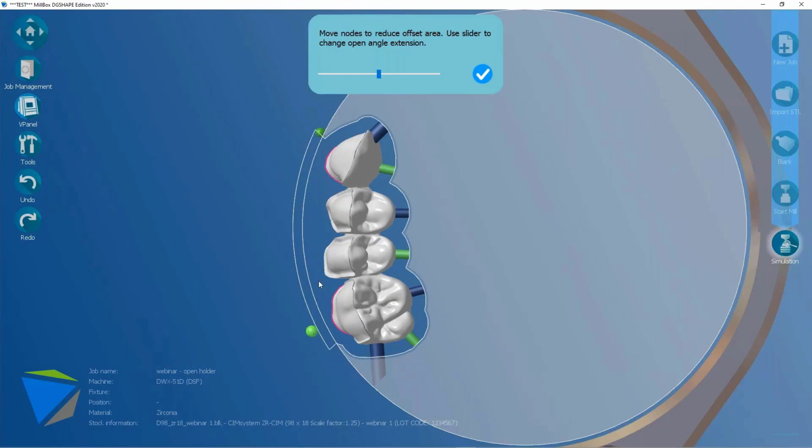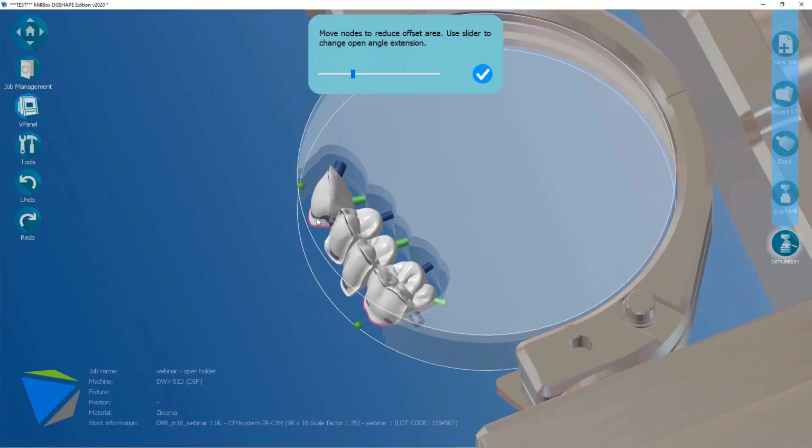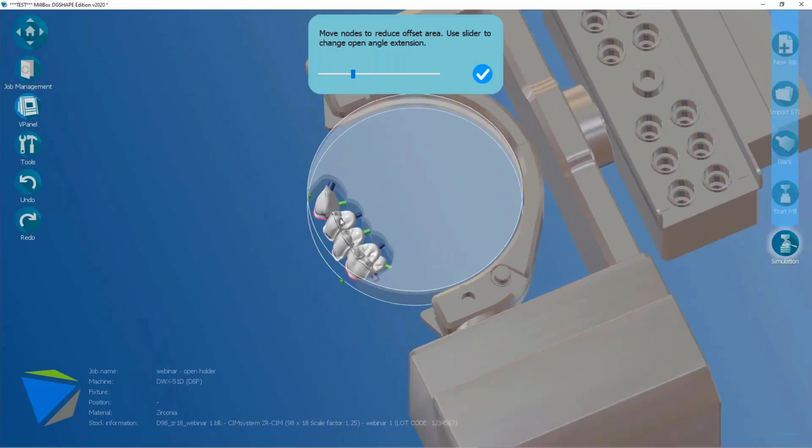Because, for example, I need only some area that I desire. Okay, so in this way, I can quickly modify the area that I want to adjust. And thanks to this extra cursor, I can say, okay, enlarge or not this opened area. It's good. It's for sure a good trick.